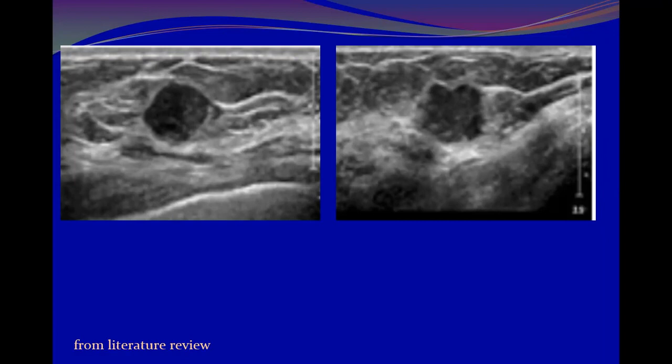The lesion on the left is more perpendicular, and on the right it is oblique, I think. Okay. Tell me the characters of the lesion. Grade each lesion, classify each lesion according to BI-RADS.